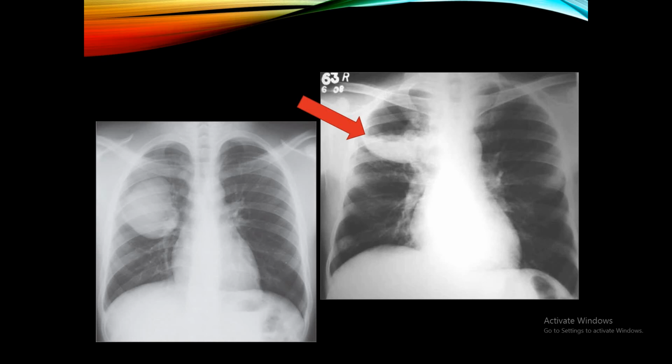طبعا هذا المريض بعد ما عمل انفستيجيشن والى اخره رجع بعد فترة بهذه التشيست إكس-راي واذا به هذه الماس تحولت الى cavitary lung lesions with the air fluid level، لكن هذا الاير فلويد ليفل ليس ستريت وانما wavy، الساين اللي نسميها ووتر ليلي ساين وتكلمنا عليها بالمحاضرات النظرية، واللي هي تعتبر ساين specific to hydatid cyst. فإذا this mass طلعت بعدين hydatid cyst. بالحقيقة هي مو مشكلة الراديولوجيست متى ما يشخص lung mass لازم يبعث المريض إلى CT scan، وبالCT scan ممكن يفرق لنا إذا كان هذا fluid density أو كان soft tissue density. So as a safe radiologist, you should first exclude the bronchogenic carcinoma.